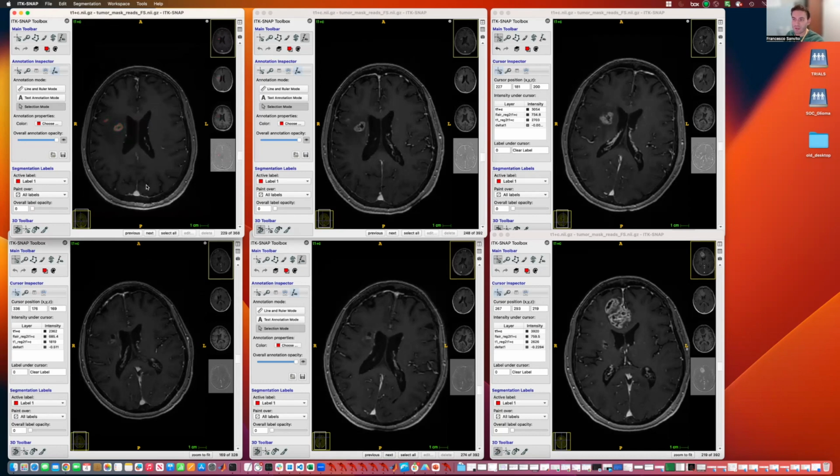Now I'm activating and deactivating the visualization of a segmentation. That can be done with all time points. So you can get a sense of the images, the measurements, the diameters, and also the volumetric measurements with segmentations all at once, which I think is very helpful when you have to do an overall assessment.